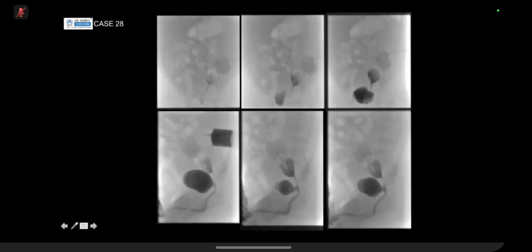And the reason the bladder has been opacified at the same time is because, as the candidate said, we've got a colovesical fistula. So if you look, this is the rectum here that's been opacified with contrast, and then if you look here, there's a connection between the urethra and the rectum. So this is your fistula. So it's actually a colourethral fistula rather than a colovesical fistula. But this is your connection here. So it's just going into the posterior urethra.